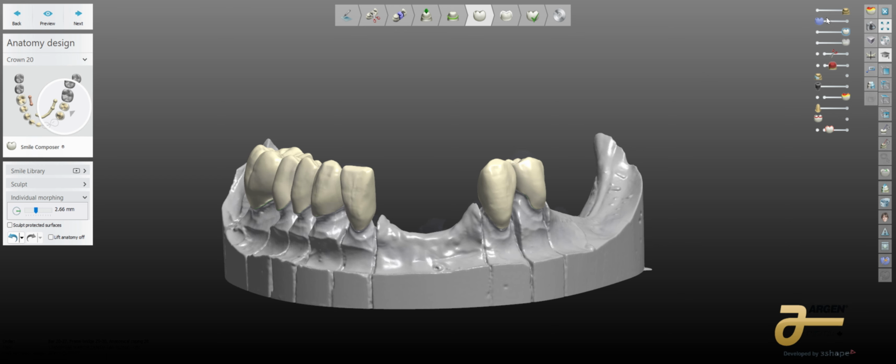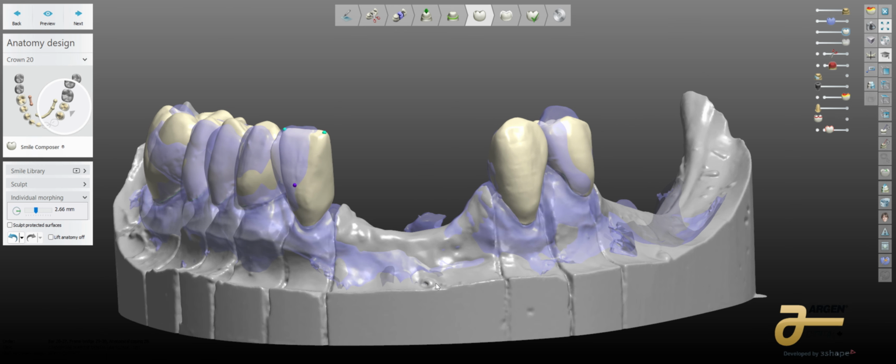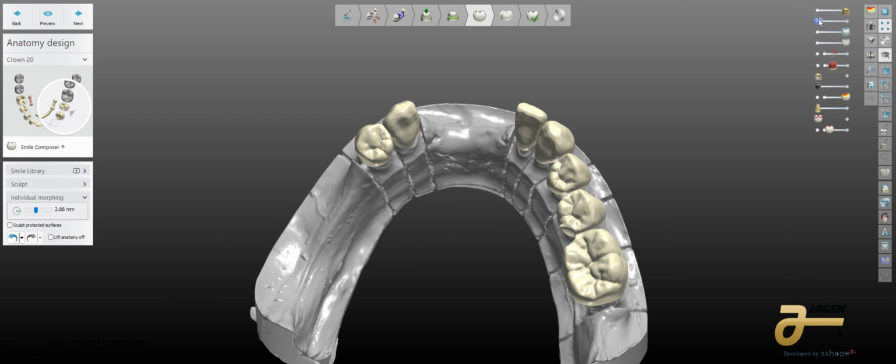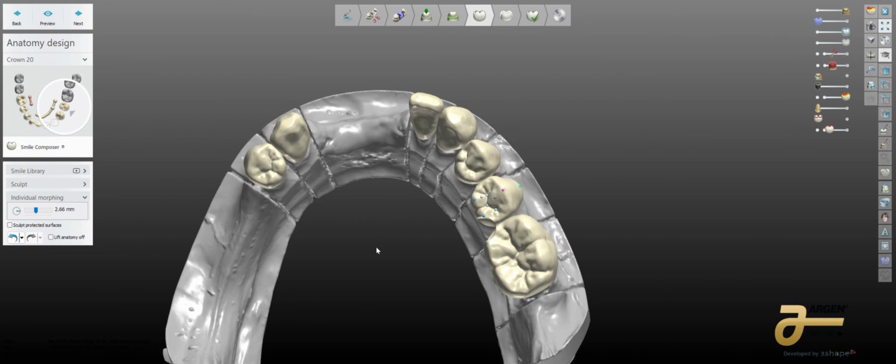It starts with understanding where the teeth were, all right? This is my plane of occlusion. It's opposing another denture that we're going to be making a new denture on. So I have everything I need to make this ideal because we're going to finish up the lower arch and adapt the current denture to it and be ready for us to make a new denture with it. All right, so we have this information. Now let's take a look at our anatomy as it's presented here and think about what we're trying to accomplish.